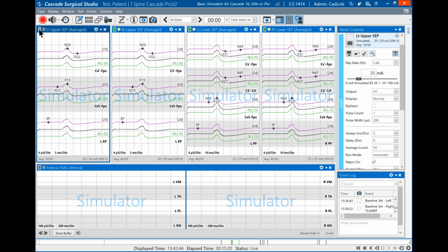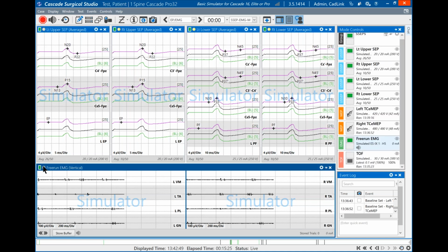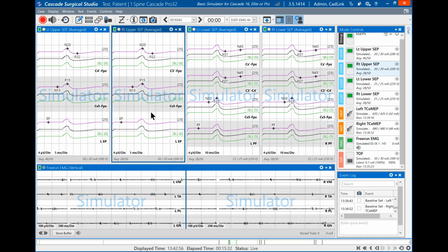Entering events. As long as I'm not in a sub menu like a mode window or something, I can just start typing. No longer do you need to type Control C to start and enter events. So now an event is entered here. I just put in hello. Also up on the menu bar, if I choose event, I can have my predefined list of events.